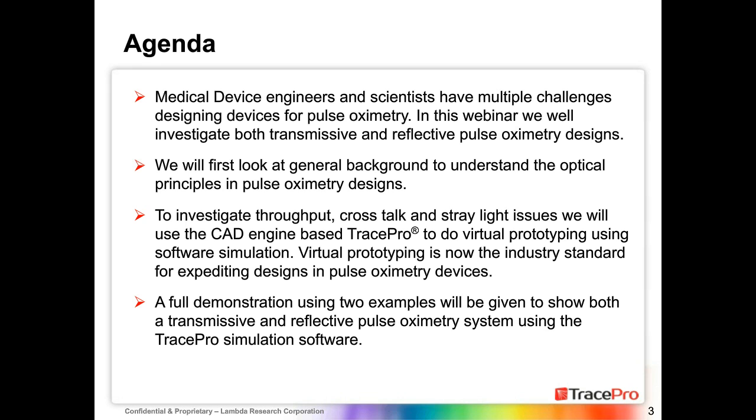As everyone knows, virtual prototyping is now the industry standard for doing this type of analysis in pulse oximetry devices. It really helps to expedite the design phase. With this full demonstration of these two examples in both the transmissive and reflective systems and using TracePro, we're going to go through and see where problems are, where they exist, and how to get rid of them.